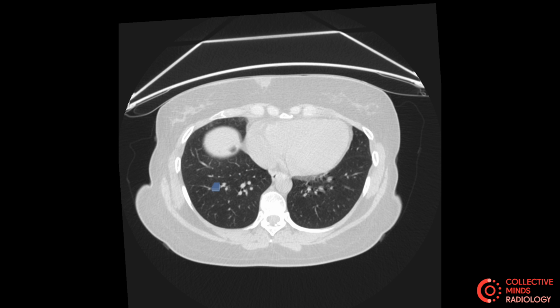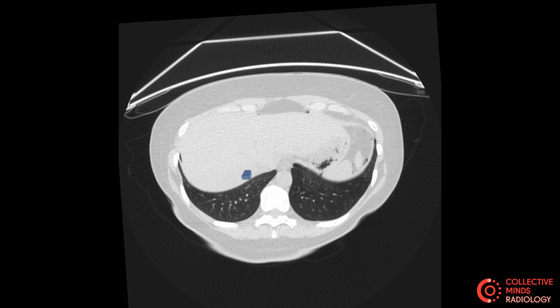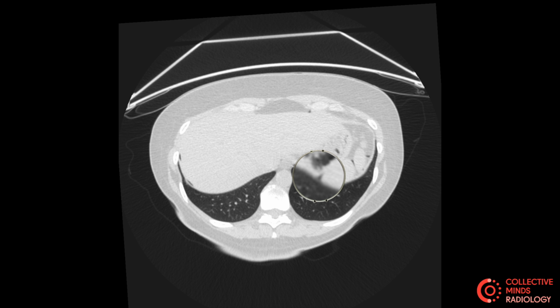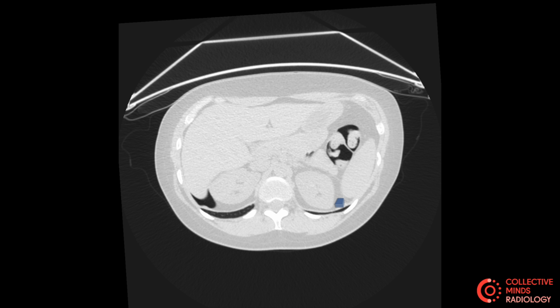Those are the lung windows, and as you can see, there is the lung parenchyma, and all the air within it is very, very black. And as you come down, you can see the diaphragm sitting over here, and then beneath the diaphragm there's evidence of the same black-like density sitting beneath there. And as you scroll through, you see a little bit there, a little bit there. You can see a few locules of air sitting just around the spleen over here, a few locules of air sitting over here as well. And as you come further down, just beneath the hemidiaphragms, adjacent to the spleen, which is sitting over here, you've got some air as well.